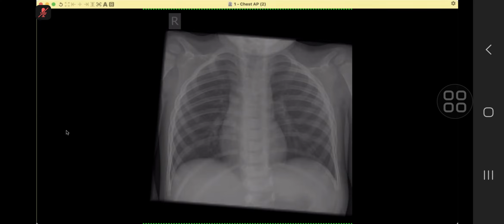And if there is a unilateral finding on the right side, I can think of Sprengel's shoulder, but both of them are showing almost similar views, and the humeri are subluxed superiorly as well, most likely due to the absence of clavicle. I would also like to count the ribs in this patient and see the vertebrae for any hemivertebrae or associated anomalies, because it has an association with a lot of other bony abnormalities.